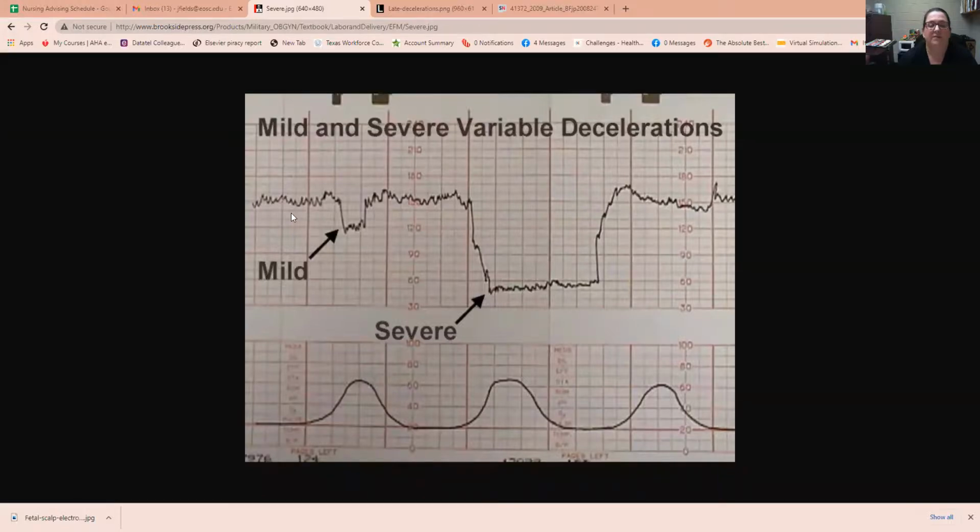Okay, we still have, let's see, fetal heart rate baseline 150, probably moderate variability or close to it, right on the bubble of minimal to moderate. I would call this moderate, especially if I had a longer strip that looks similar. No real accels.